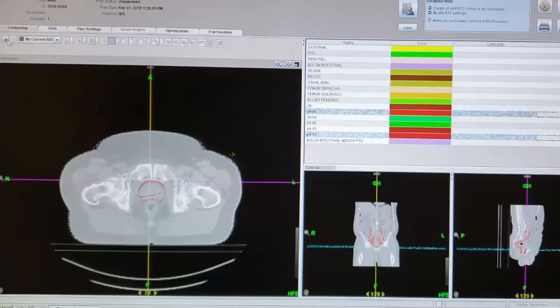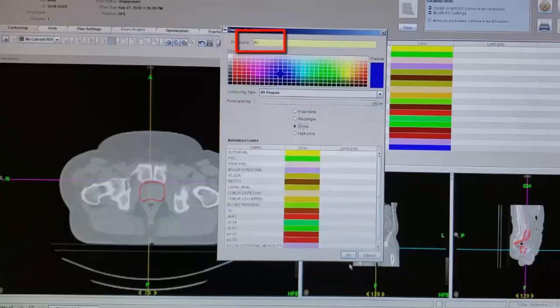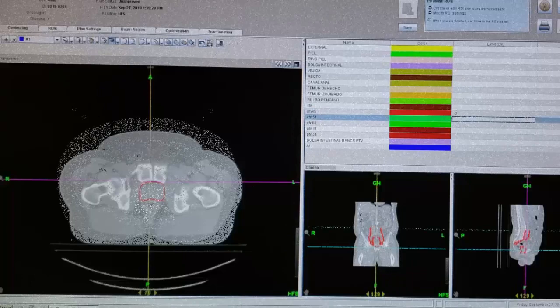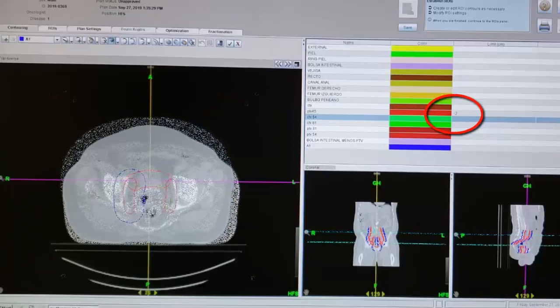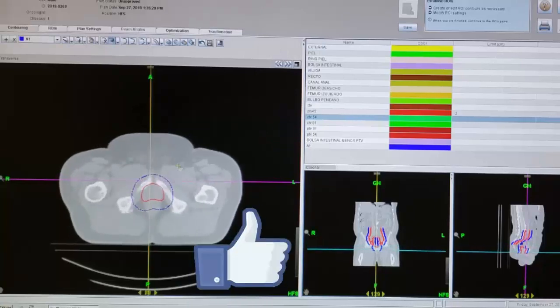Now we begin with the contouring for our auxiliary structures. The first one will be called A1. It's a structure that will have the following characteristics. It will be 2 centimeters outside of the PTV 45. Once we are done contouring, now we reduce points and check that it's complete.